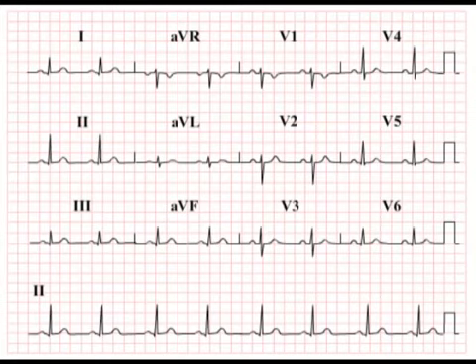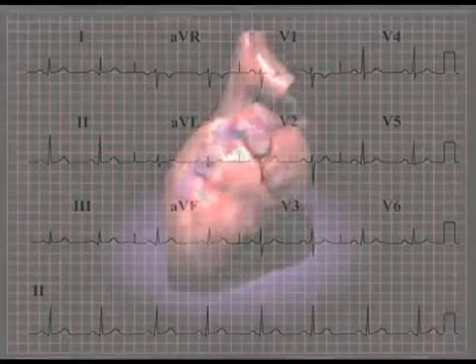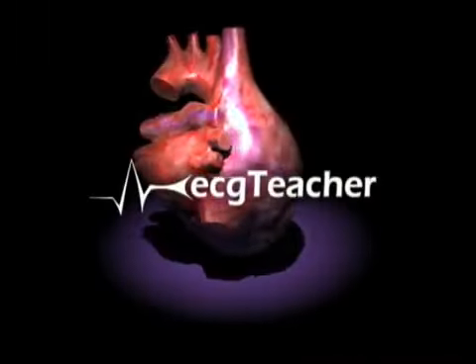The ECG we've generated here is a good guide to normality. However, it will rapidly become obvious to you when you start to review patients' ECGs in clinical context that there is tremendous variation in normal ECG morphology in perfectly healthy individuals. Hopefully by the end of this course you will have some grasp of what is acceptable normal variation and what is pathological.